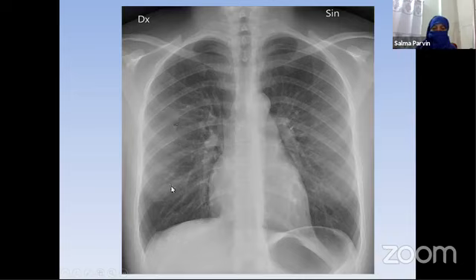You can read from the anterior aspect, and also you can go through the posterior aspect, as this is the posterior end of the first rib, this is the second, third, fourth, fifth, sixth, seven, and so on. So you can ask, should I count the position from the anterior aspects of the ribs or the posterior aspect? What should we go for?